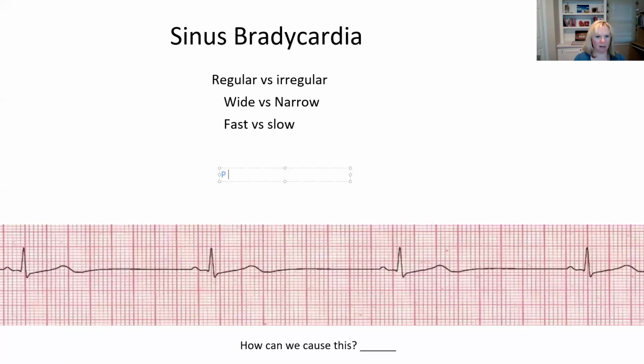We have a P wave. It is slow and it is a regular rhythm.